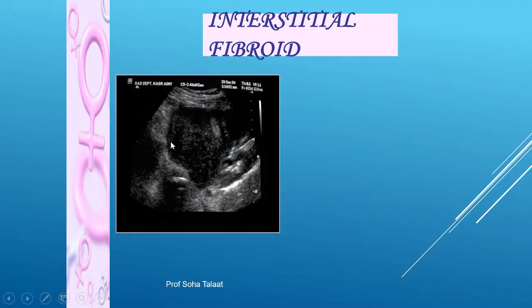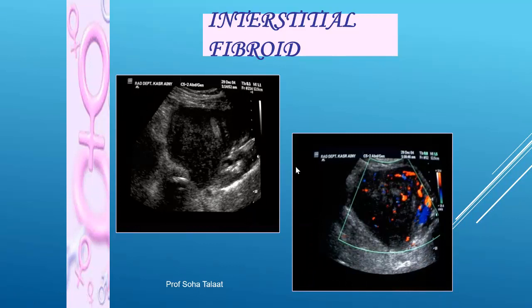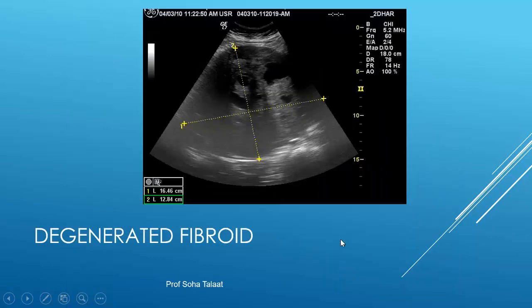Interstitial fibroid also, vascular on color Doppler. Please, when you find the myoma vascular, it is not necessarily so vascular that it is malignant. It may be just normal vascularity, peripheral, maintaining a benign character with normal arborization, so this is a benign finding in the fibroid.